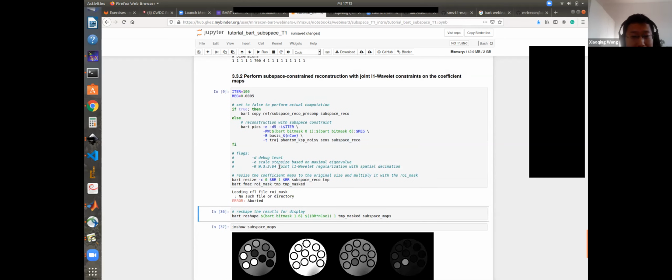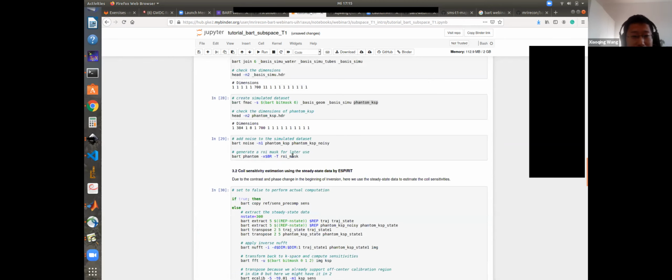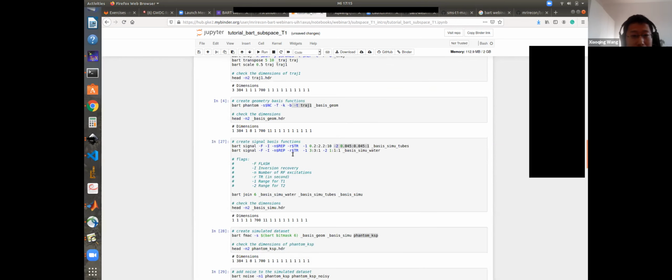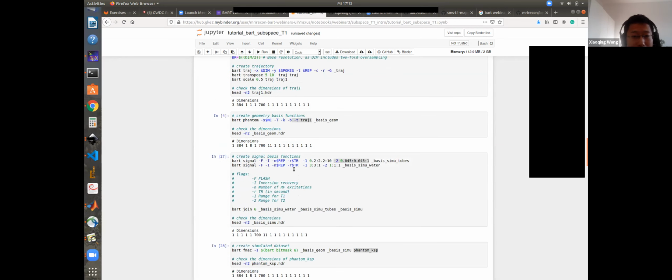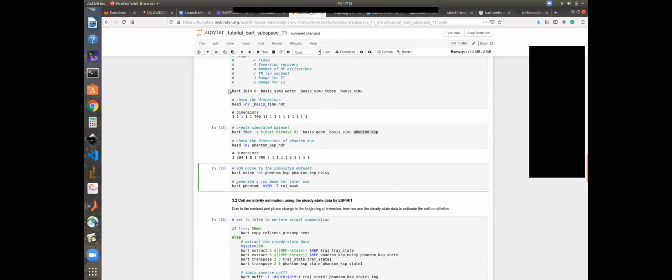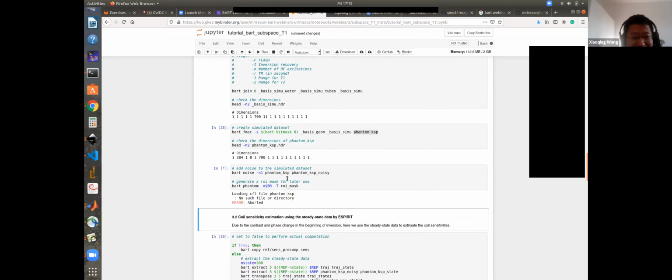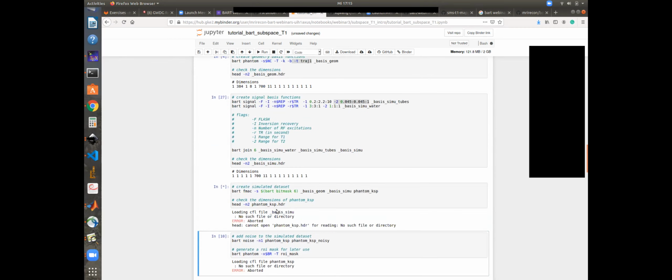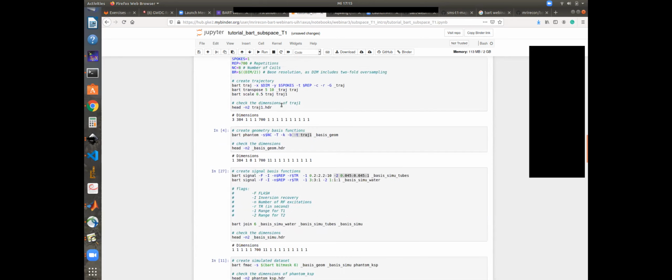Oh, okay, I didn't run the raw mask in the beginning. I think you weren't running all of the cells interactively. Oh, okay, sorry, from the one that says N27, I think you need to start. Okay. Yeah.